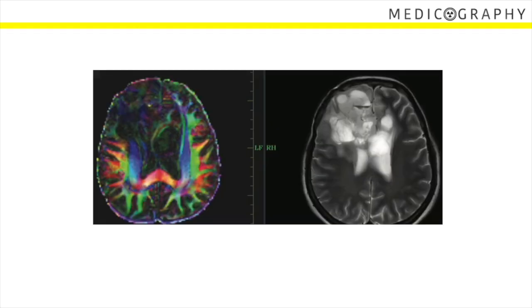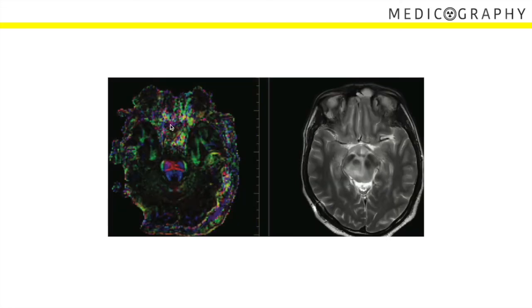This is another example. I got it from a journal. You can always Google others. This is a 36 years old male with GBM involving the bilateral frontal lobes and the corpus callosum. See the butterfly pattern. And in this image, the color map DTI shows complete destruction of the superior longitudinal fibers on the right side, and also the corpus callosum we cannot see anymore. It's already destructed.